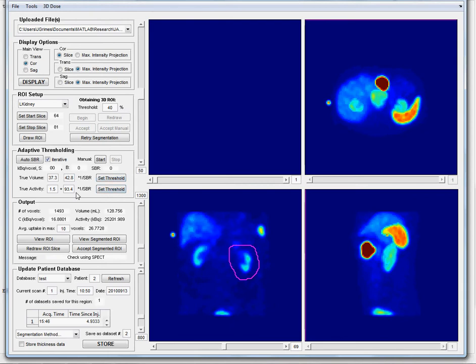These are the values you will find for the clinical reconstruction method in the referenced paper. But keep in mind these fit parameters for performing this adaptive thresholding are institution specific, so these will need to be calculated using your own phantom experiment.